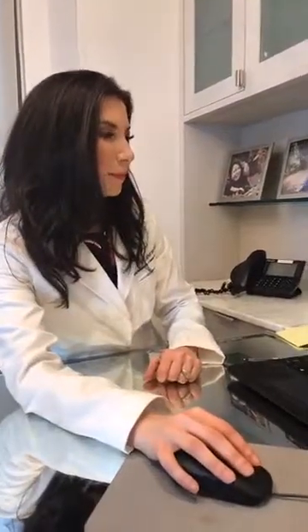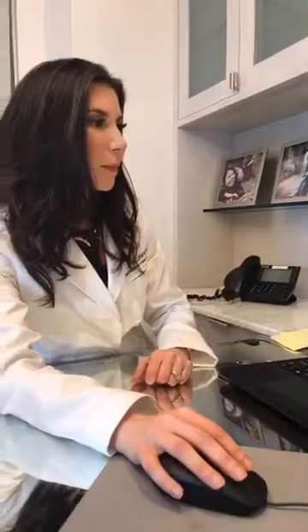Oh, are there any questions? So what other procedures can you show a patient's simulations? We don't have to do it on the screen, but what other things can patients see?